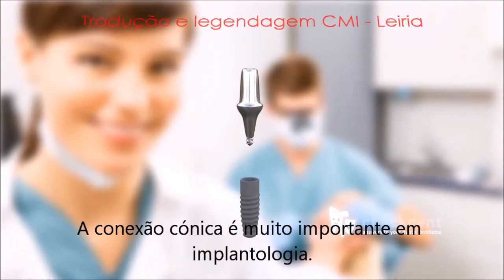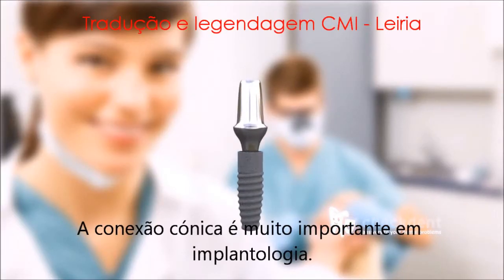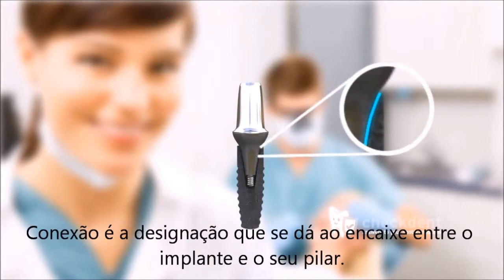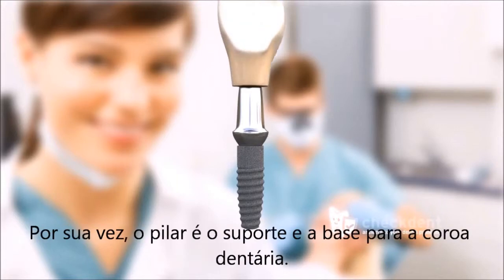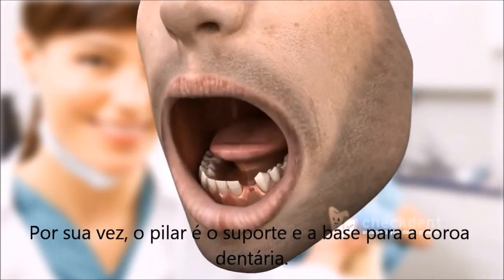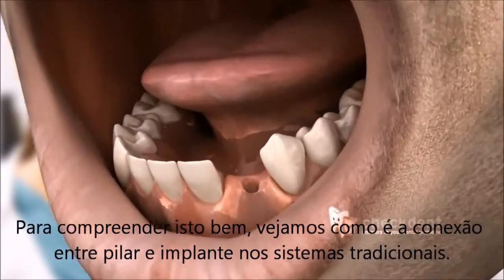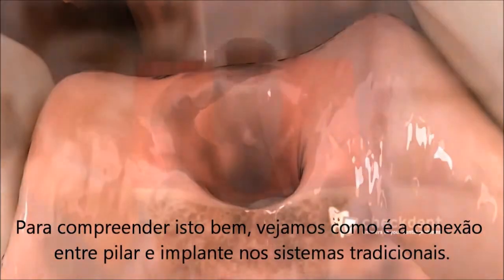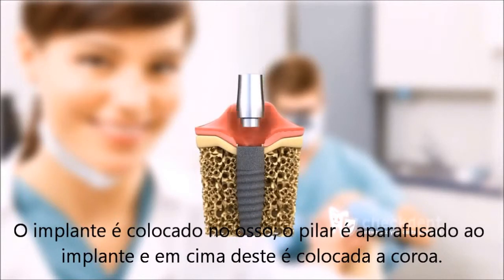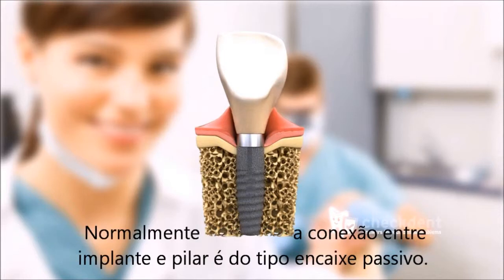The conical connection plays an important role in implantology. A conical connection is a connection between an implant and its abutment, which is an implant cap that functions as a crown base. To understand this better, we will show how an abutment is screwed onto an implant in a conventional implant system. The implant is placed in the bone, then the abutment is attached to the implant, and the crown is then attached to the abutment.